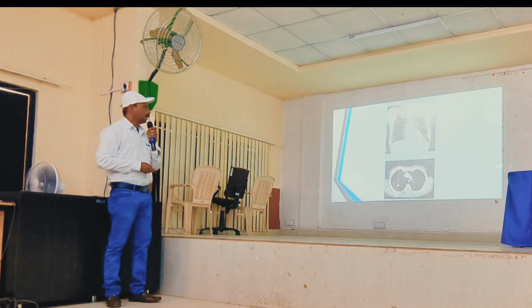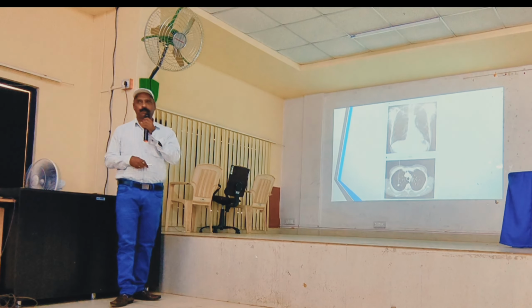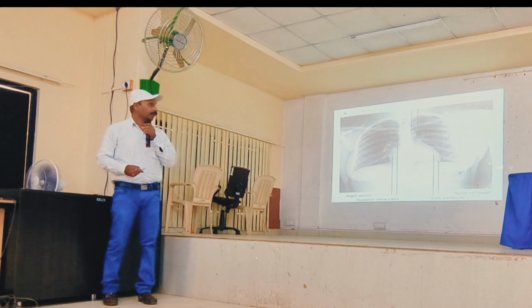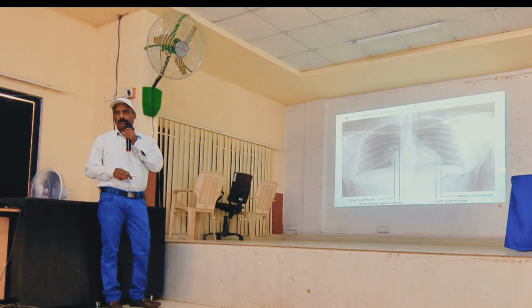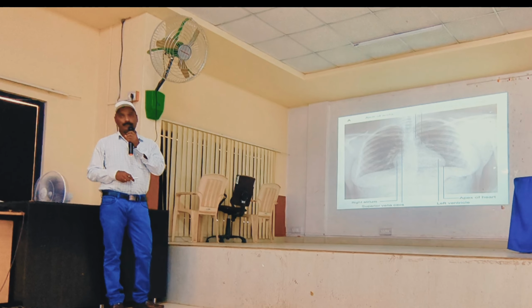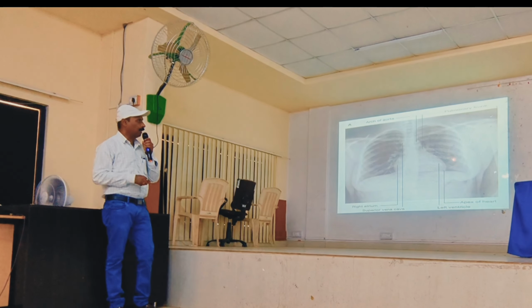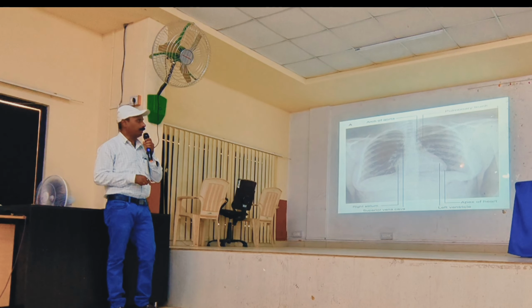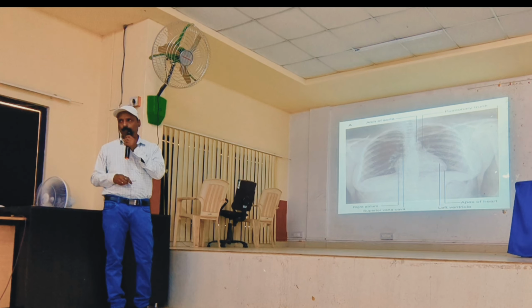Okay, so this is the one which is a PA chest, which is on the superior, we are going to get it. So this is also same, apex of the heart we have to concentrate where it is situated. Is it cardiomegaly is there, then we are going to get the heart shadow is enlarged with the apex which is going towards the chest wall laterally.